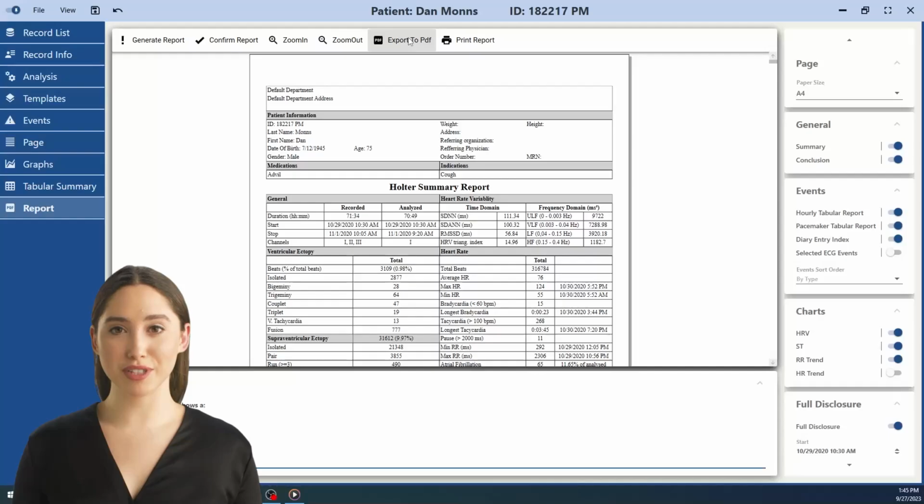Congratulations! You've completed the ECG analysis with the NORAV NH301 Holter analysis system. And that wraps up not only our tutorial on scanning and analysis with NH301, but also this entire tutorial series.